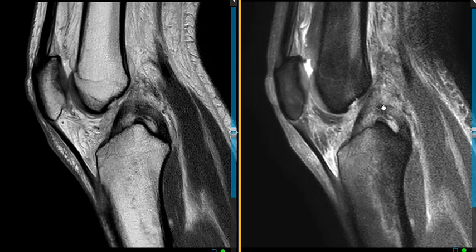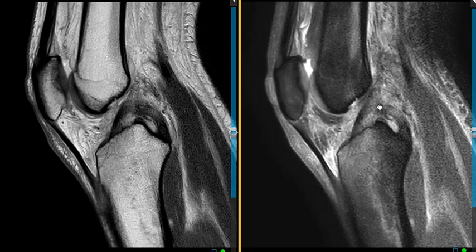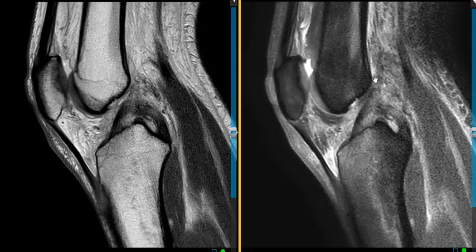And this is not straight and taut. It's lax and curved. If we go on a couple different slices here, it never connects to the femur. So this is a torn PCL. It's lax and it's torn from the femoral attachment. And also, if we go back on one slice here, we see the posterior joint capsule behind the knee is lax and it's not even visualized in this area.